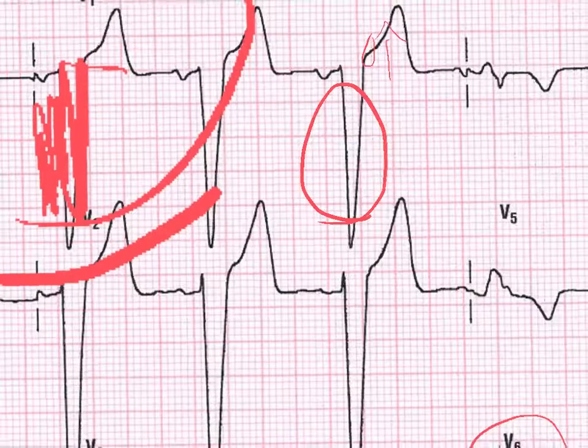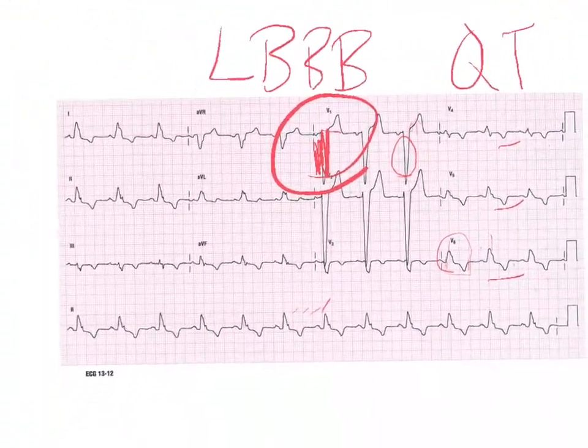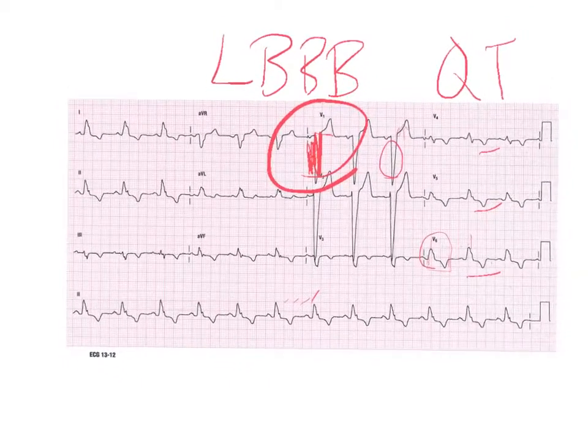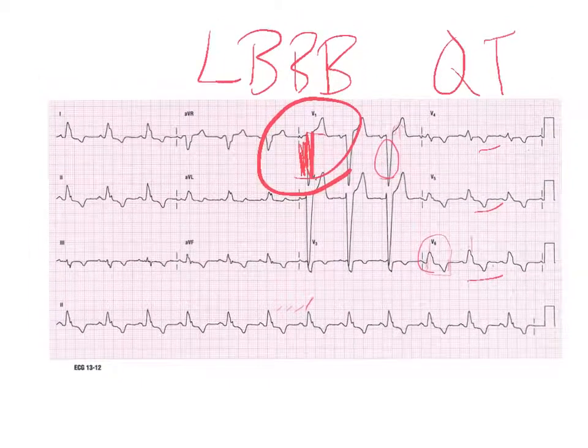that we will be dealing with how to look for injury, ischemia, and infarct in a left bundle branch or pacer pattern. So the analysis on this is we have a left bundle branch, and we have a prolonged QT interval, and we have a number of flipped T waves with a pretty wide QRS that goes along with that left bundle.